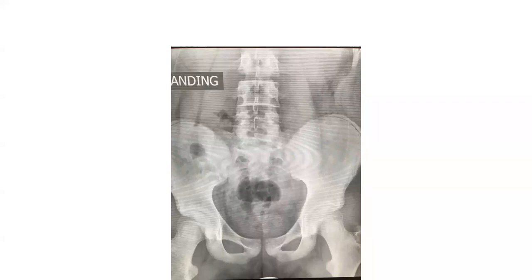So when we take an X-ray, okay, what are we trying to look at? Well, we are trying to look at the structures in there. So we're looking at the pelvis, right? And I can see a lot of things here. I can see the outline of some of the anatomy, okay? So I think you all would look at that and say, well, those look like spinous processes, but I'm just looking right down the middle of it, so they're more dense when it hits a tangent and it's going through more bone. Well, wait a second. What about right here at S1?